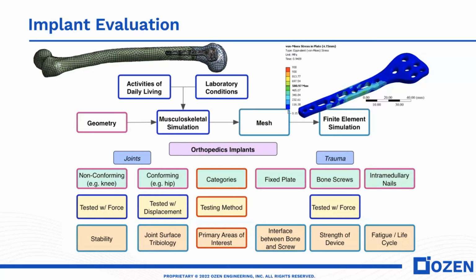And then to evaluate the implant, we can add the finite element simulation part, where the musculoskeletal simulation brings in the different muscular forces as well as the joint forces into the finite element model for any activities of daily living, any lab conditions, and any geometry of the implant that we are considering, so that we can address the strength of the implant as well as any questions with respect to the fatigue and life cycle of the implant itself.